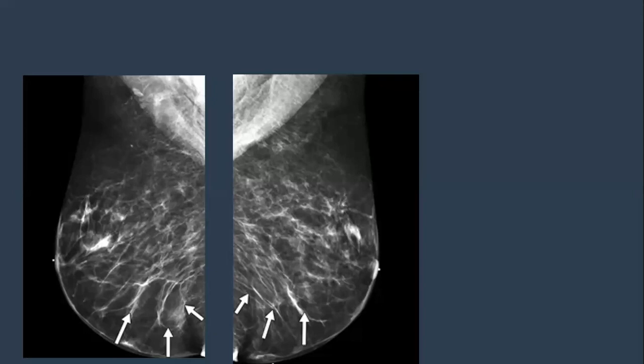Excellent, well done. Now you start to think about surgery. Which type of surgery would you like to ask about? It is a bilateral surgery, so it may be plastic surgery like breast reduction or something like this. Excellent, well done. Good approach. Yes, plastic surgery, breast reductions.